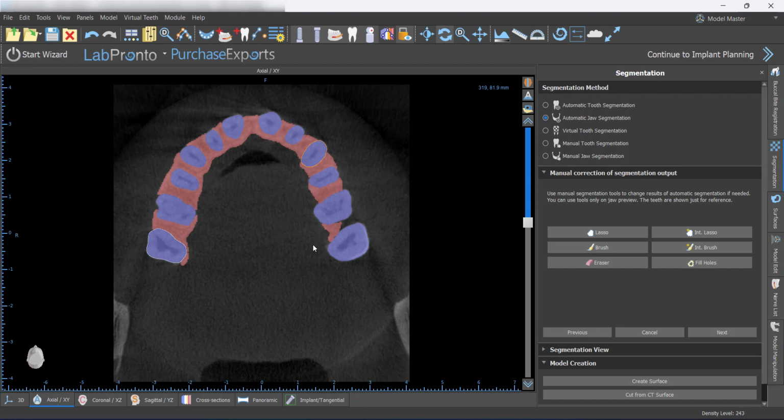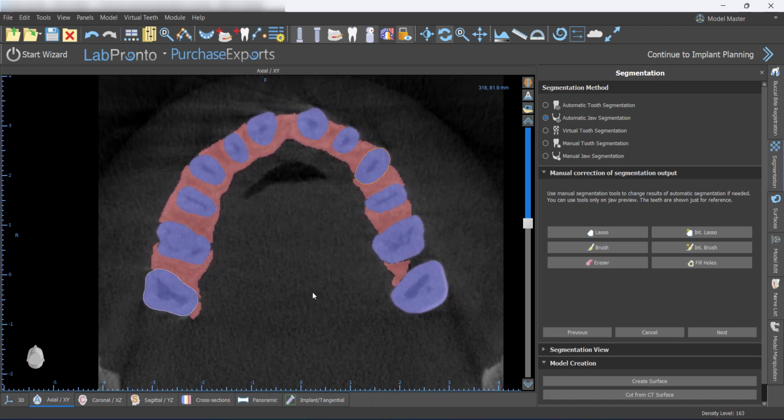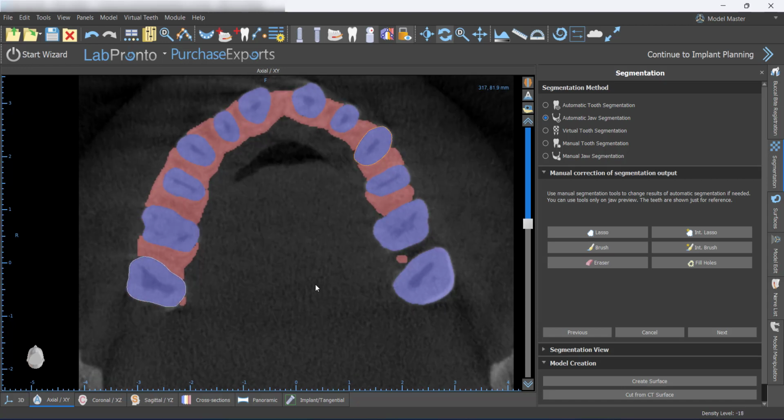So this is actually one of my favorite parts of the Blue Sky segmentation AI feature as opposed to all of the others. AI is great, but in my experience, usually there's going to be some isolated area where it misses. And if you're using an outside service, you don't really get an opportunity to input into that. So when that's happened to me with other services, what I would do is just go in and whatever isolated area it missed, I could just manually segment that.